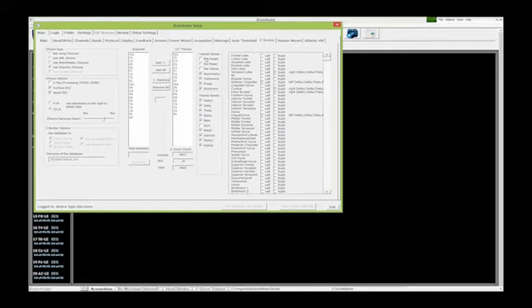See, this is where we have a little difference in understanding what's going on right here. These trained values, absolute power, relative power, power ratios, asymmetry, coherence, and phase, only affect sites, so they only affect FP1, F3, C3, P3, O1, F7, and so on. When it comes to voxel EEG, once I check Brodmann, I am automatically doing absolute power to any of the regions of interest that I'm choosing here. That is what's dictating that I'm doing the absolute power training on it. Does that make sense? All right, excellent.